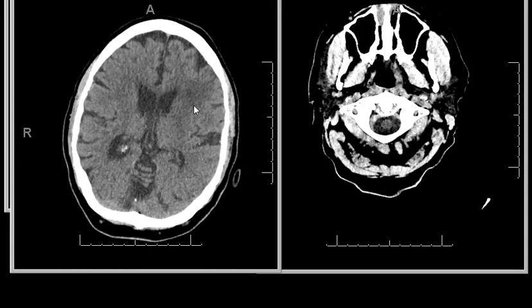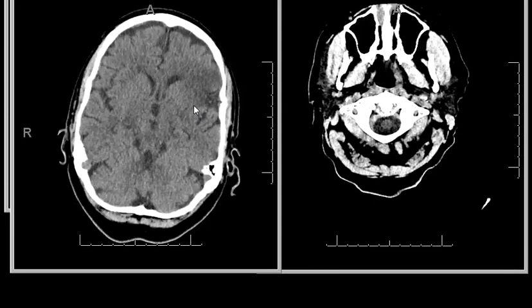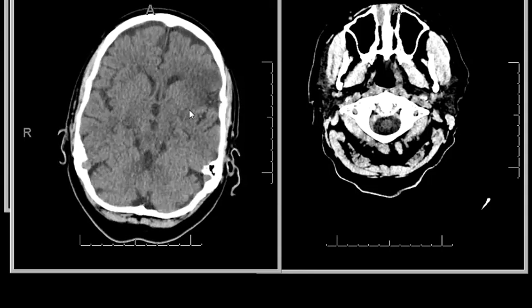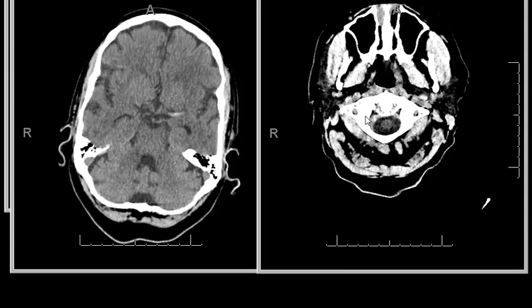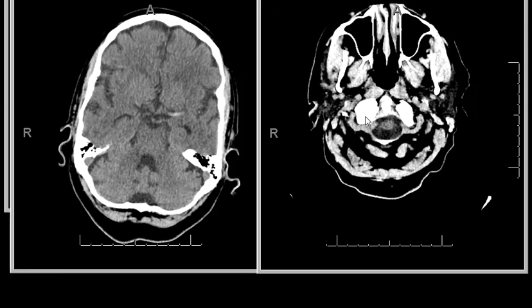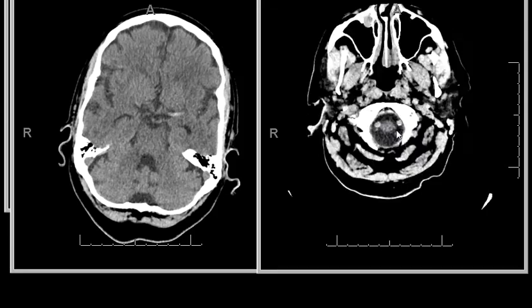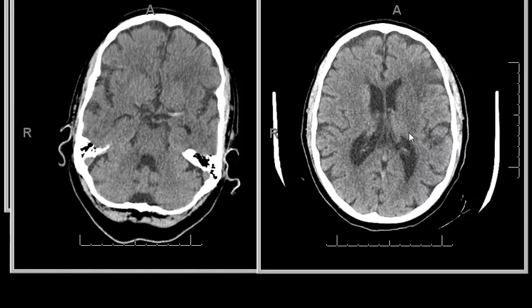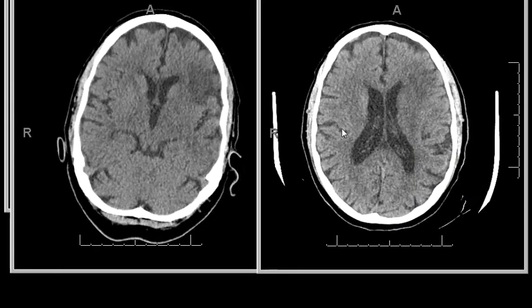But that doesn't matter. At the time, our local radiologist reported that this is a hyperdense blood clot. The ER was trying to manage the patient conservatively, but the radiologist persuaded them to transfer to our main hospital to be treated. So this one is about 2.5 hours later, at 11 o'clock, basically showing some evolution of ischemia.